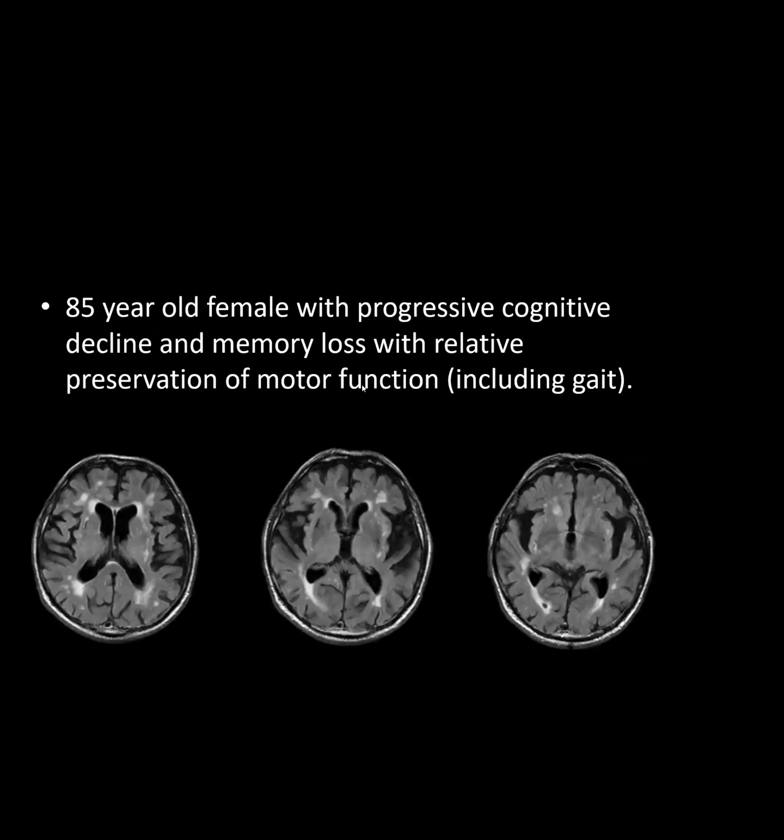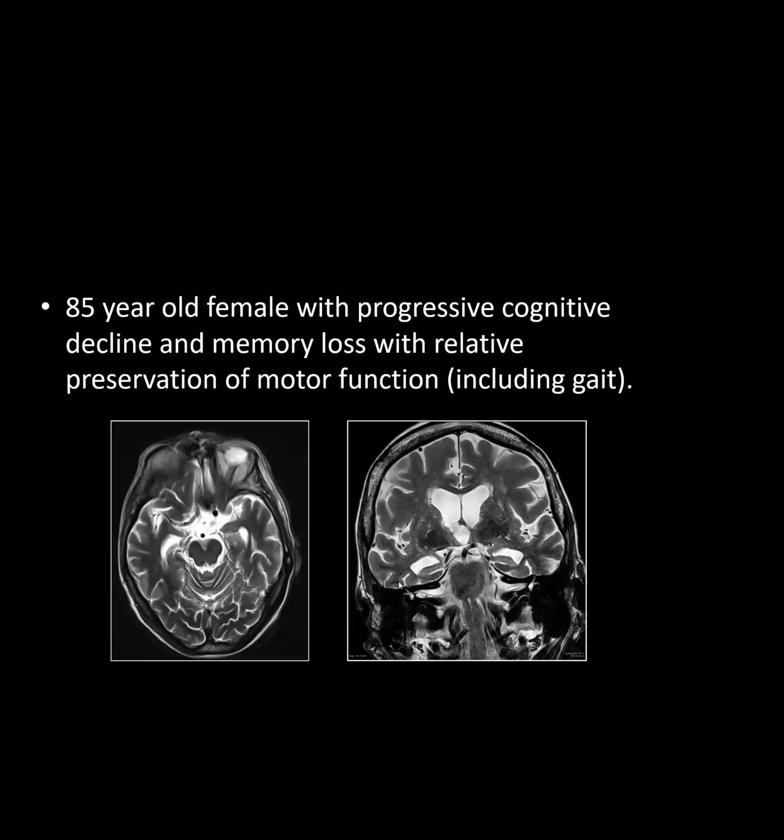Let's see. So Jihan, just take this case and take a look at it and tell me where you see the atrophy. Actually, this is probably a better example.